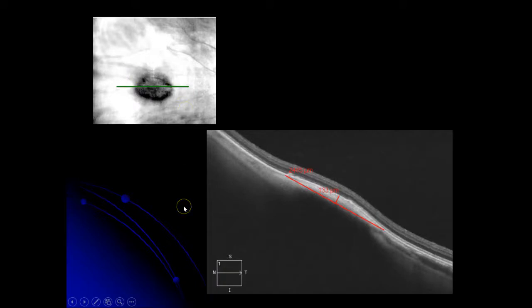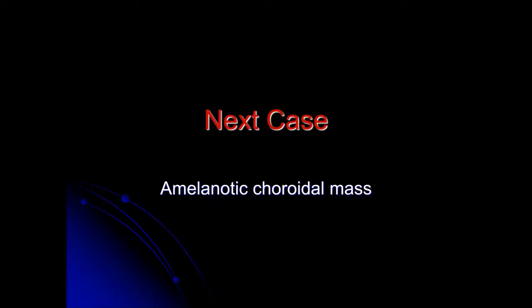And that nevus is actually not completely flat. It was elevated by about 133 microns. We get concerned when lesions are elevated by 1 to 2 millimeters. This is just about a tenth of a millimeter in elevation. So it is elevated, but to a minimal degree, and all the structures look intact. Where is the nevus? The nevus is really right about over here, and it's just pushing everything ever so slightly forward, which you may pick up with a binocular indirect, but probably not. But you can pick it up with an OCT. OCT gives us the ability of looking at 5 to 10 micron resolution.